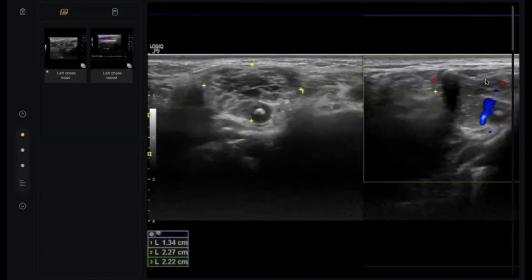First of all, I am thinking about aggressive lesions. What else? It could be due to complicated lymph node involvement, such as lymph node necrosis. Doctor, one second. What about this? What is this?